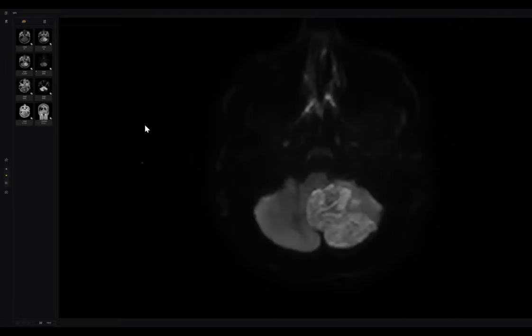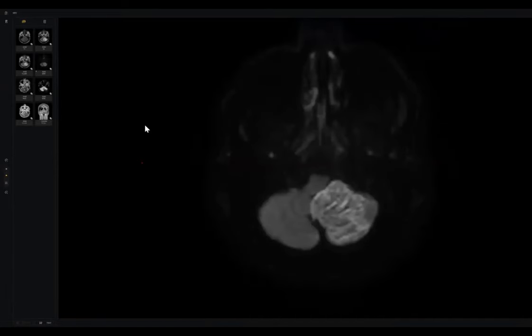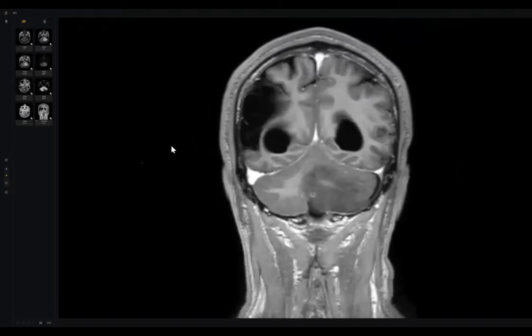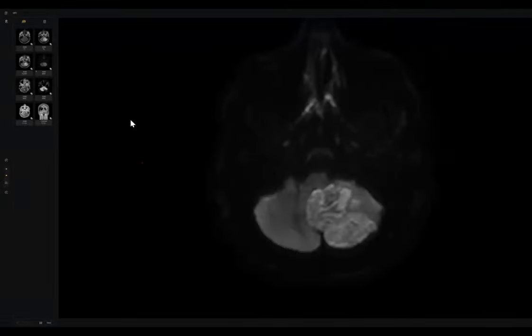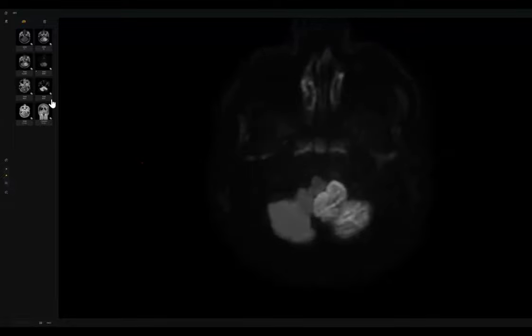Okay. What's your other differential diagnosis? Sir, the other could be a cerebritis or I think Lhermitte-Duclos syndrome, which also gives this type of picture. But do you think Lhermitte-Duclos syndrome will show this restriction? No, sir. So what's your final diagnosis? The final one is an acute infarct of the left cerebellar hemisphere.